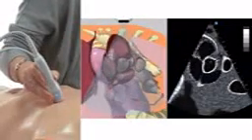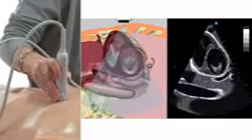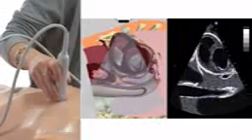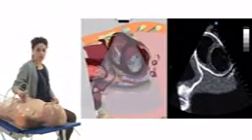Here at the base, you can appreciate the inflow, outflow of the right ventricle. You see, starting from the tricuspid valve, going to the pulmonic valve, and in the mid-ventricular space, you can see that the right ventricle has this normal crescent shape, and this means it doesn't have overload and doesn't cause overload for the left ventricle.